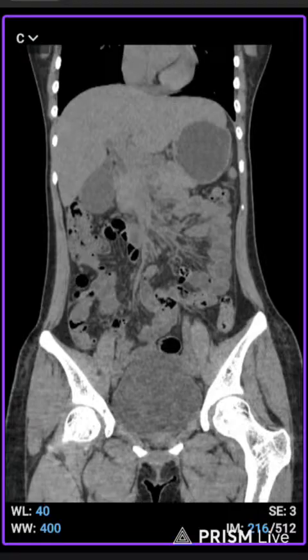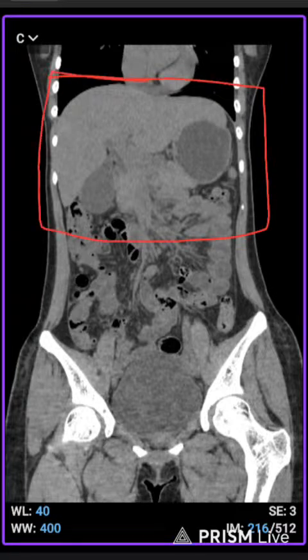The patient should not panic during the scan, because it feels like a little warming in your mouth and a warming sensation happening in your body. It's nothing, just normal for a few seconds when the contrast is injected. After that, in a liver scan, you have to hold your breath during the scan, so that the tumor or wherever the problem is shows properly.